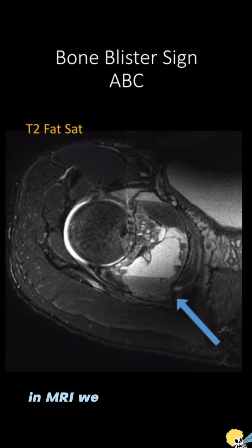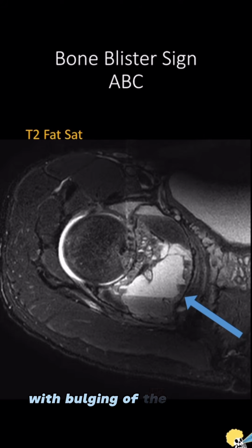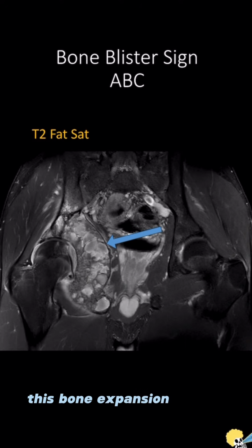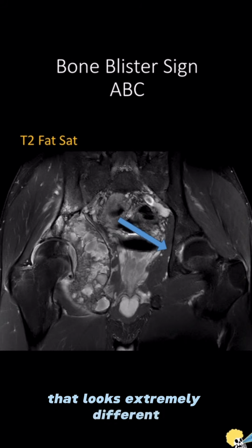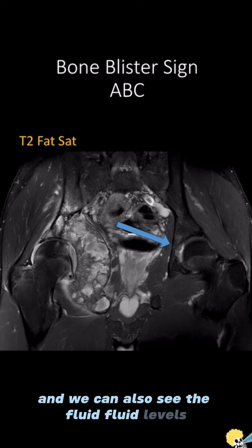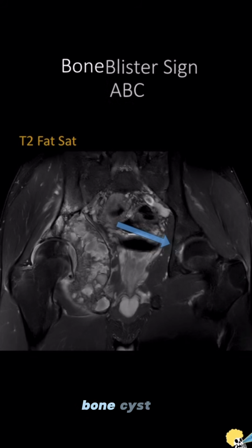In MRI, we can also see the bone expansion as we see here with bulging of the medial acetabular wall causing minimal mass effect upon the true pelvis. This bone expansion can be marked as we see here in this coronal image that looks extremely different from the normal appearing left side. And we can also see the fluid levels as well as the bone marrow edema associated to this large aneurysmal bone cyst.